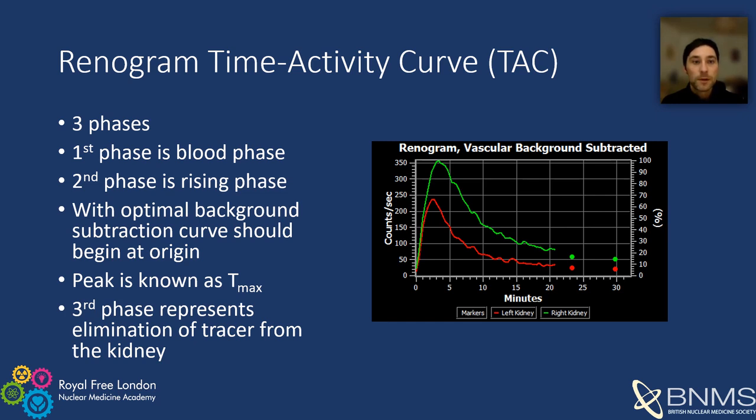This is followed by a slightly more gradual slope, indicating renal uptake of MAG3 by glomerular filtration and tubular secretion, until it reaches a peak at roughly 3 minutes. This defines the point at which tracer entering the kidney is equal to tracer excreted by the kidney. The time to peak may be delayed in patients with renovascular insufficiency, renal failure, and obstruction. It could also be delayed if there is a poor bolus injection or extravasation.